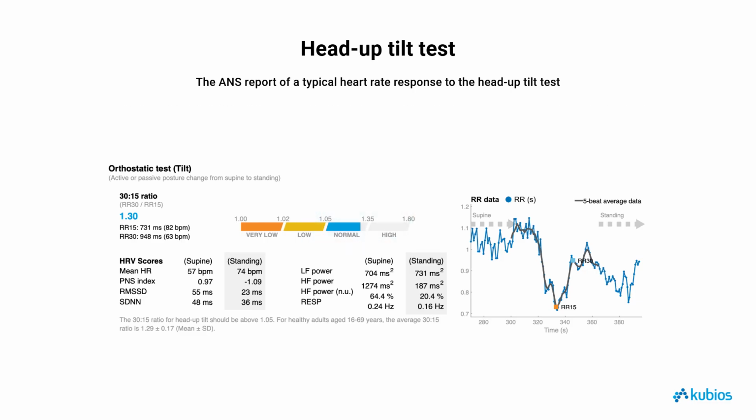Various HRV parameters can be evaluated to examine autonomic function changes during the transition from supine to upright. The supine position provides baseline heart rate and HRV values during spontaneous breathing. The parasympathetic nervous system index should decrease, reflecting the reduction in HRV associated with parasympathetic activity due to the postural change. Standard time domain and frequency domain HRV parameters can further elucidate the change in ANS function.